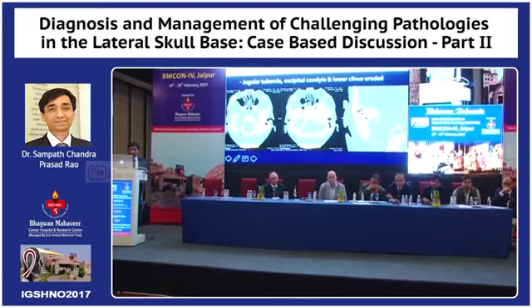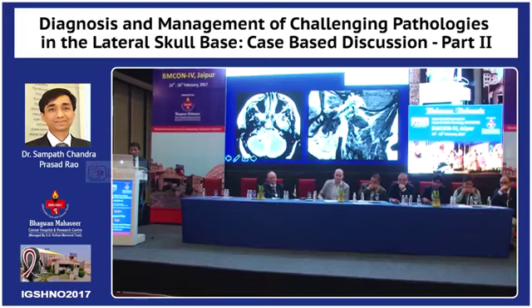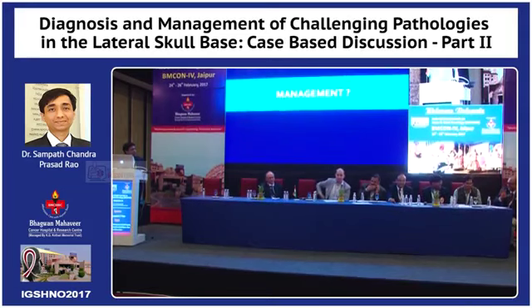Now, jugular tubercle eroded, occipital condyle eroded, going far medially. You see that this tumor, this is another case, involving the carotid. You see the highly vascular tumor, involving the carotid for sure, with the intradural component, with the long leg component, managed. I'm not, it's not my fault. I just refer the case to Eisenberg. Okay. Maybe to Rupa? Yes, okay. Okay. Thank you. And Amit and the others? Everybody refers to this.